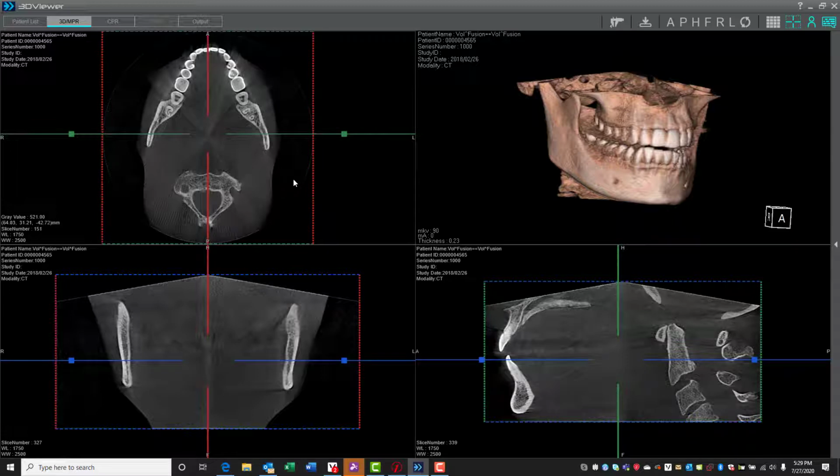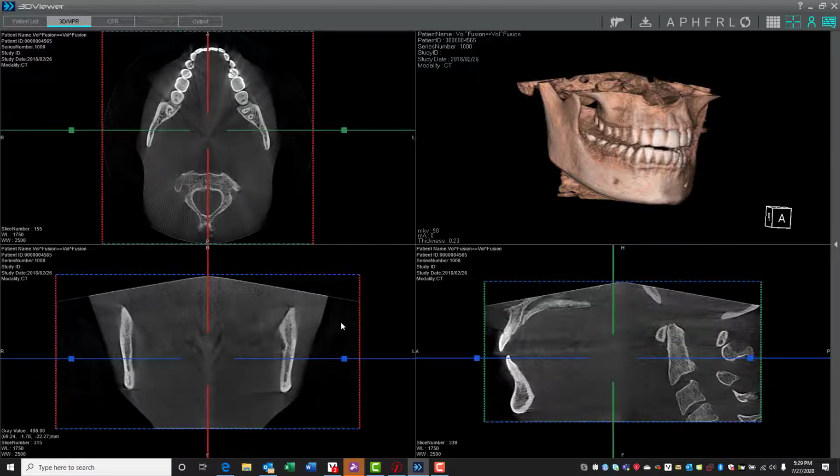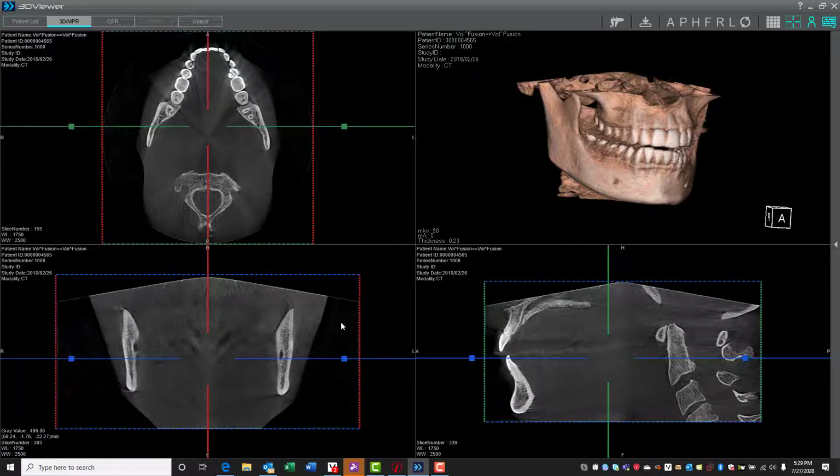Walking through the slices is a great way to explore the anatomy. In addition, walking through the location of a pathology from different angles provides a wealth of detailed information to support your diagnosis.